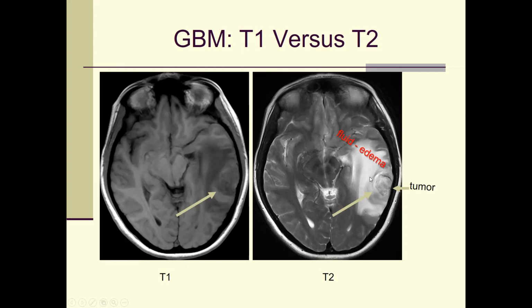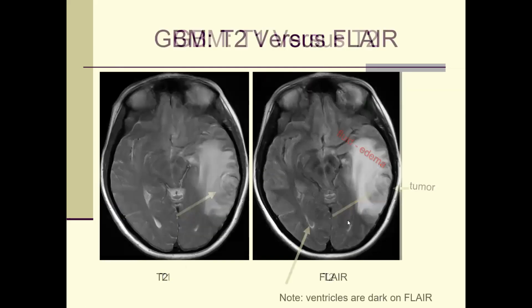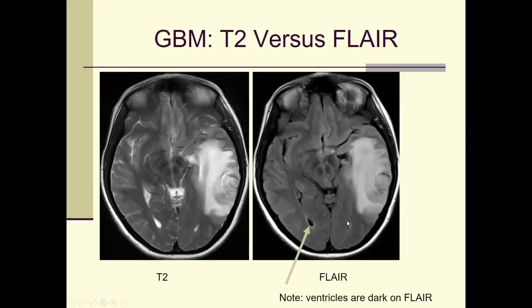And then oftentimes some of the components of the tumor may not enhance. So we also have to look at this T2 based imaging to see the non-enhancing component of the tumors. In the base of the T2 weighted imaging, which can be seen in the bright signal for the water content characteristics, we also use FLAIR imaging.